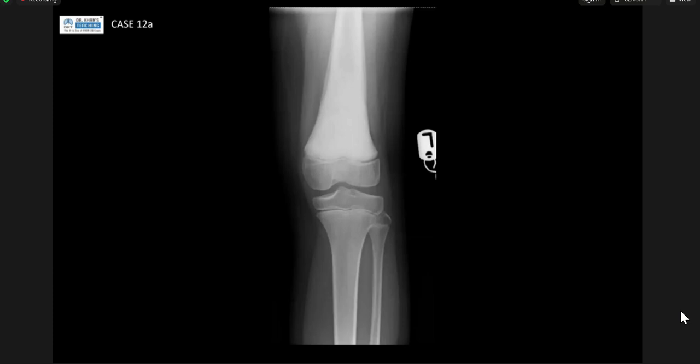Yeah. Based on the periosteal reaction, my differential was of an osteosarcoma first, but then I was thinking if at all it is a metabolic disease of lead toxicity. It's quite focal for a metabolic cause, isn't it? It's not affecting, say, the tibia or fibula.